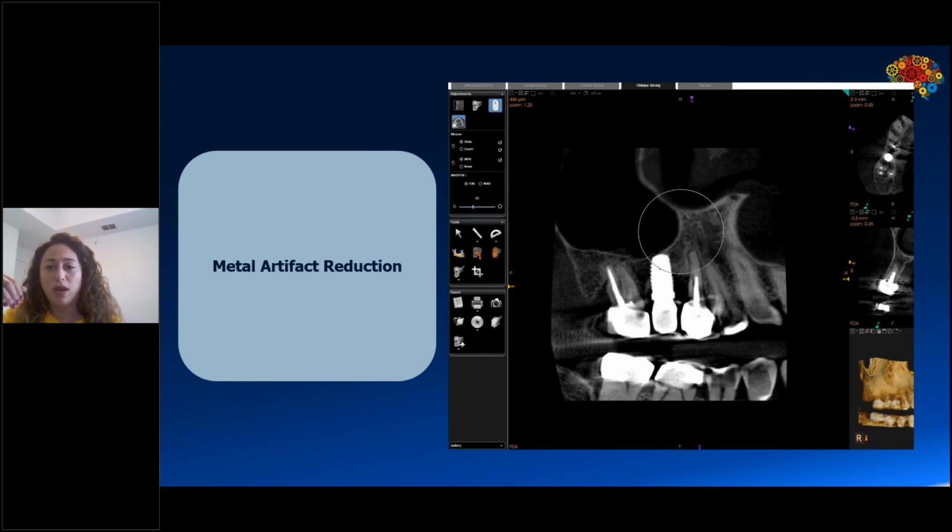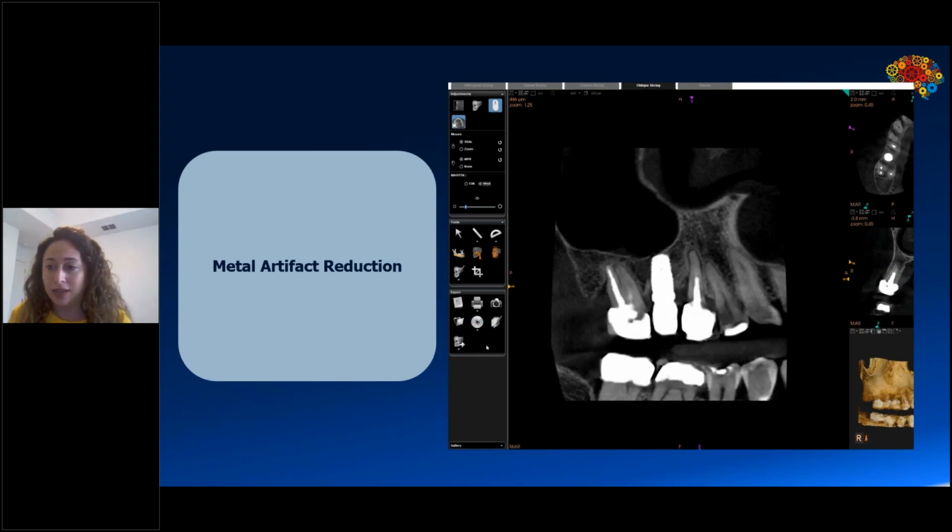So you never want a filter that is always applied to your scan. We don't really want to change what the original data looks like. We need something to enhance it, to improve it, but I always want to make sure that that improvement is doing its job, it's doing what it should do and not doing anything worse to it.